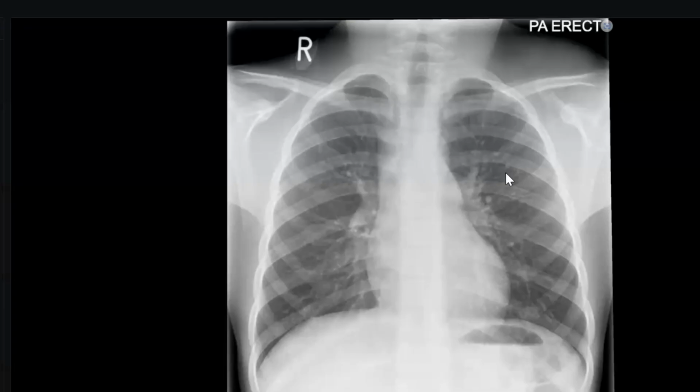Okay, so I'm presented with the frontal radiograph of a 20-year-old female presenting with a cough and left-sided chest pain. I would like to have a systemic review. The lungs are clear, no pleural effusion or pneumothorax. The heart size is normal. Regarding the thoracic cage, the ribs appear normal on both sides.